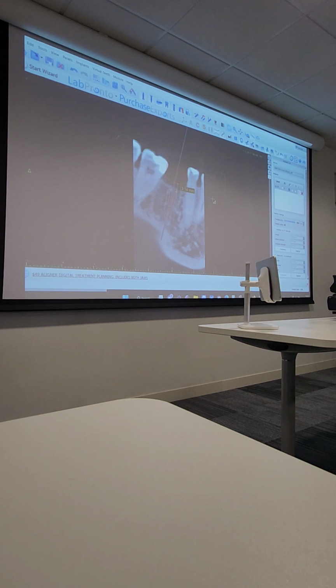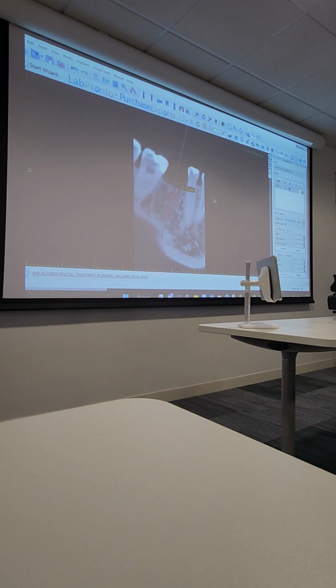That's it. Yes, there are loads of buttons there. But on a day-to-day basis, it's like using your Word document or any other software. You're using 10%, 15% of it all the time. That's the planning done, based on your future tooth. Simple. I'm not expecting you to master this, obviously. You need to practice. The beauty with this is you got it free of charge on your computers. Play around, practice. There are loads of YouTube videos as well, by the way.